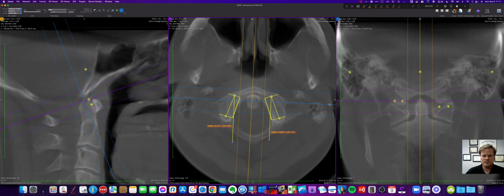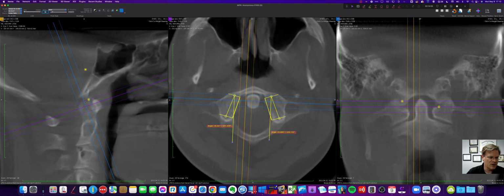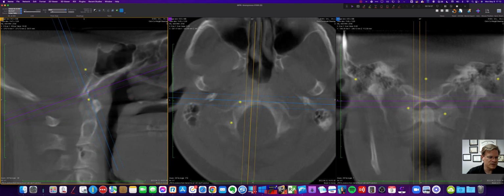but right now this is the way we do it. Until we've done the studies like Dr. Blair did. He did study, and then he would change things based on experimentation, not on theory. The theory would guide his experiments, and then he would base things after that. So what we're going to do now, all these lines are going to disappear, but my dots aren't. And I'm going to go ahead and get out of the 20 millimeter range and just go back to the 10, just so my computer's not working quite so hard.